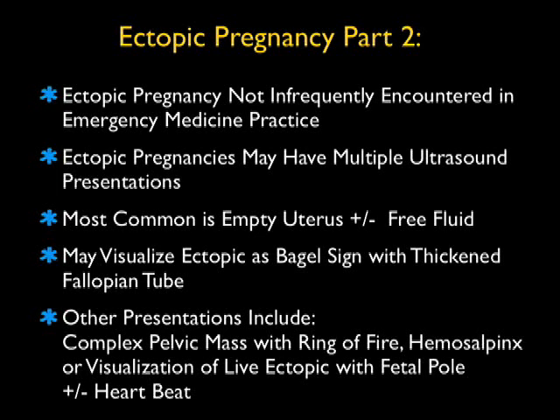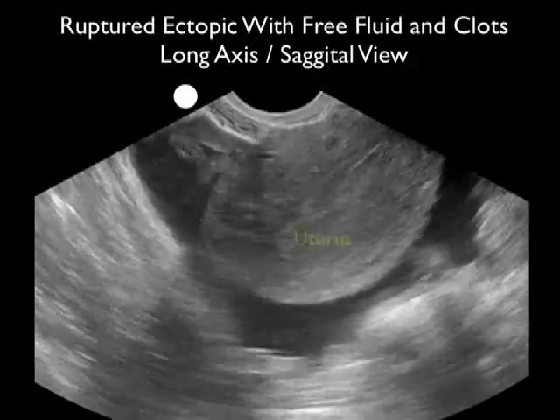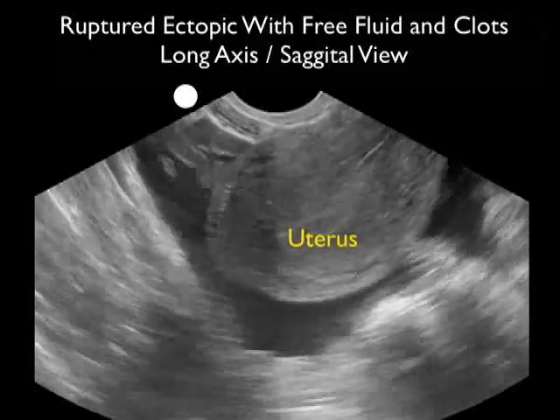We may be able to visualize the ectopic as a Bagel sign, which constitutes a thickened fallopian tube. Other presentations of ectopics include a complex pelvic mass with a ring of fire on Doppler sonography, hemosalpinx or blood within the fallopian tube, or you may be able to visualize the live ectopic in the adnexa with a fetal pole and/or heartbeat.